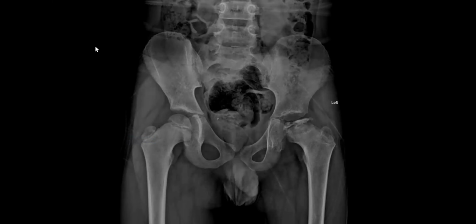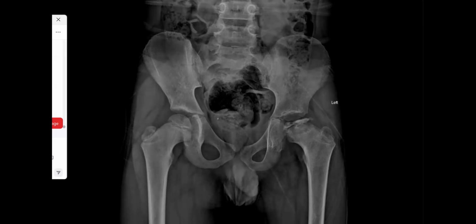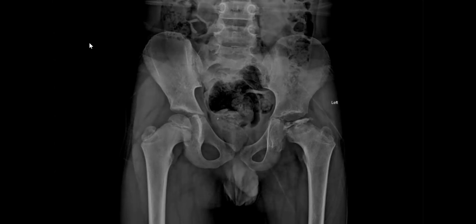Good. In children especially, please don't forget to look at the vertebrae. Why? Very important. In children, if you see a bilateral finding, look at the vertebrae. Why? To rule out sickle cell. Yes. Central depression or H-shaped vertebrae in your exam. If you see this, it's sickle cell disease.